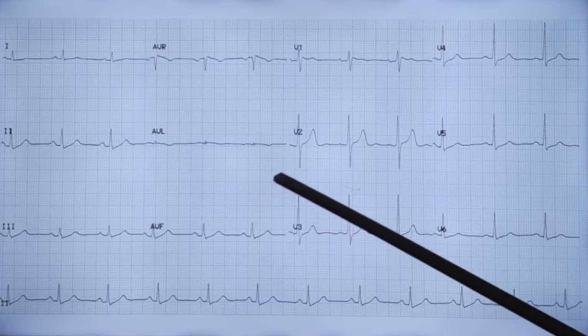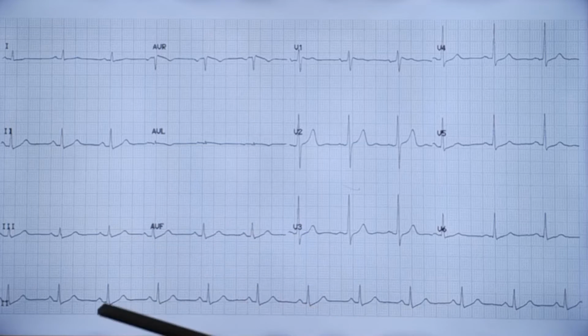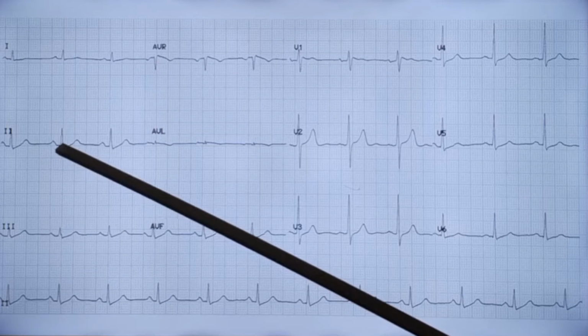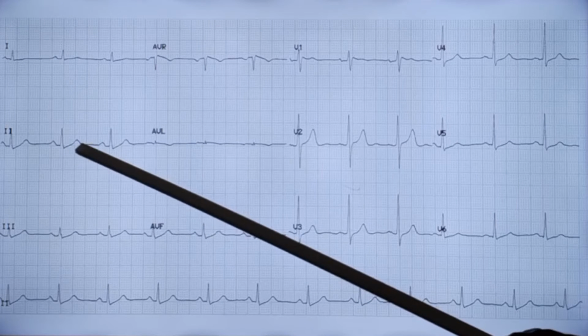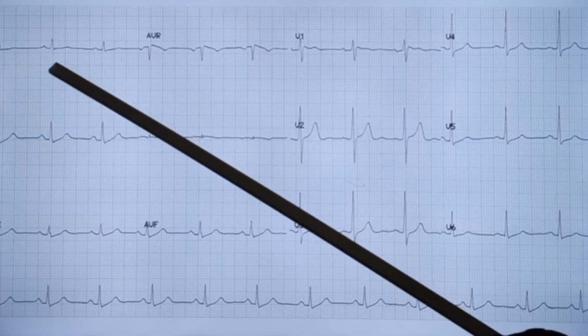And when you analyze the ECG, first you have to look at the standardization, which has not come in this ECG because it has gone beyond the screen. And then you start sequentially with P wave, PR segment, PR interval, QRS, ST segment, T wave, and this is the TP segment. Now we look at the P waves.